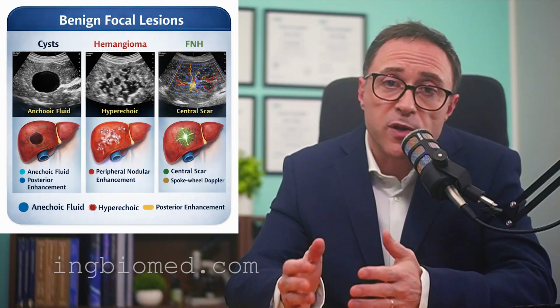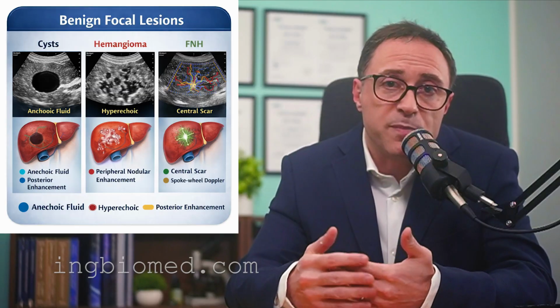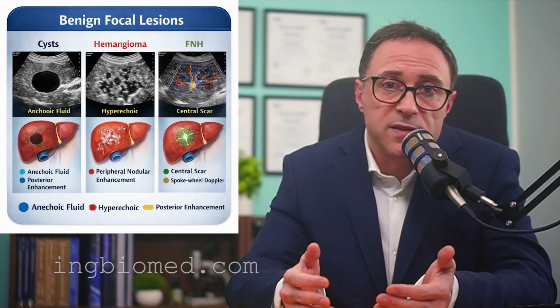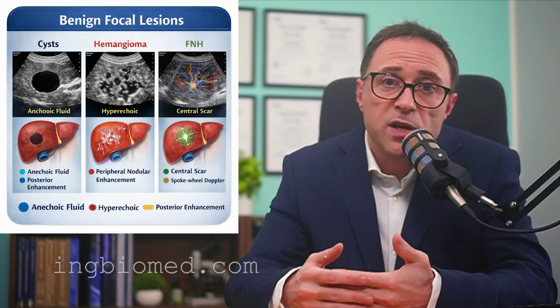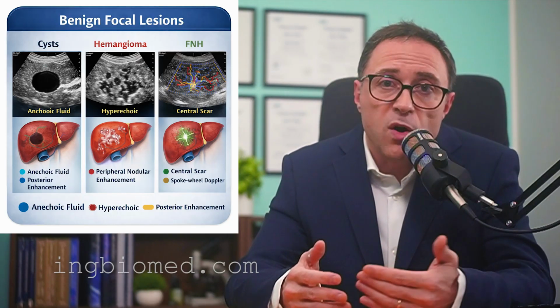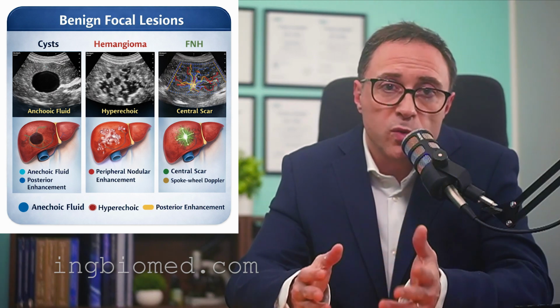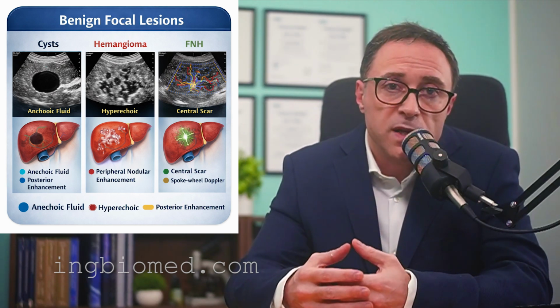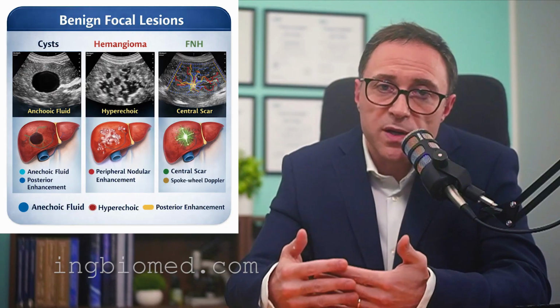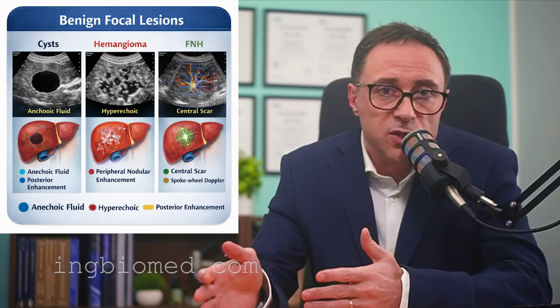Hemangiomas, the most frequent benign solid lesions, are often hyperechoic and well-defined. Their vascular behavior, especially when contrast-enhanced ultrasound is used, typically shows peripheral nodular enhancement with centripetal fill-in. This pattern is extremely helpful in distinguishing them from malignant lesions.